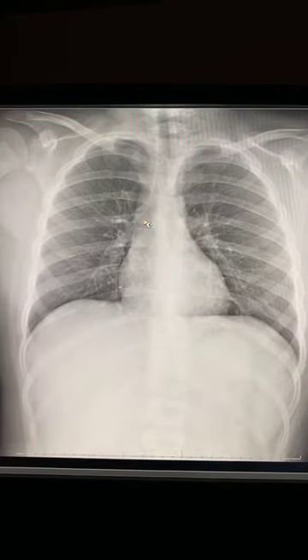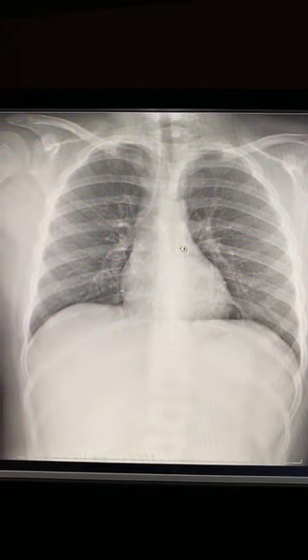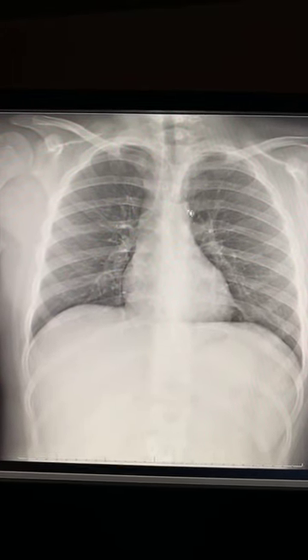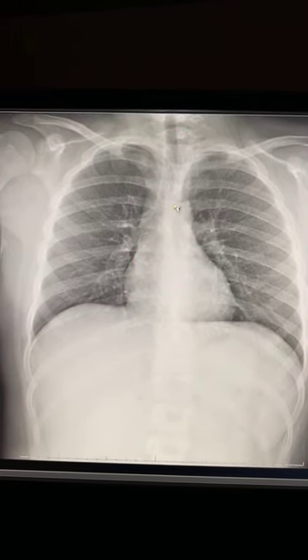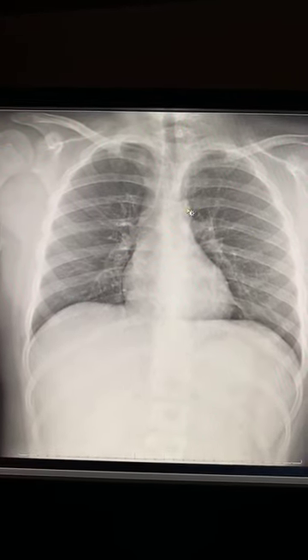Okay, so here we go. Radiology pro tip 201 right now. First of all, normally, if the patient has a normal arch on this side, remember I said this is the aortic arch right here, the aortic notch, and here's the descending aorta, that's normally going to cause the trachea to be laying a little over that way. If you had deviation that way, well then start thinking about it, all right?